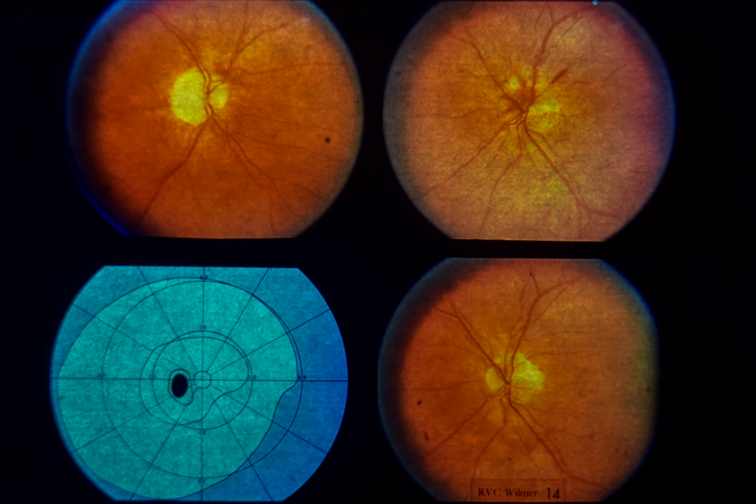Visual acuity was hand motions right eye and 20/30 left eye, with a right afferent pupillary defect and a constricted right visual field. Upper left. The right optic disc is atrophic. Peripapillary hemorrhages are presumably a residual from the acute episode 3 months previously. Upper right. The left optic disc is edematous and hyperemic, with hemorrhages predominantly along its superior aspect. Lower left. The visual field in the left eye shows an inferior nasal defect.